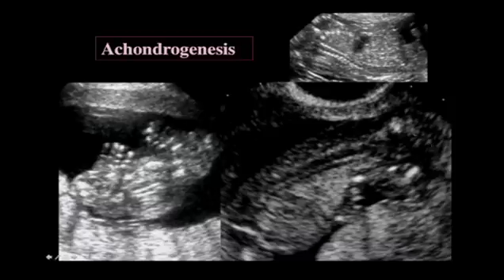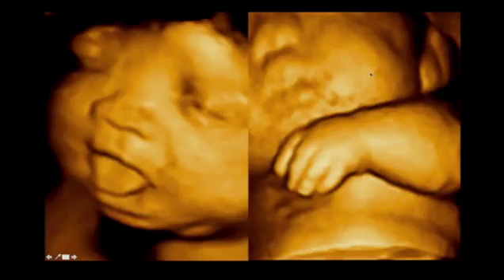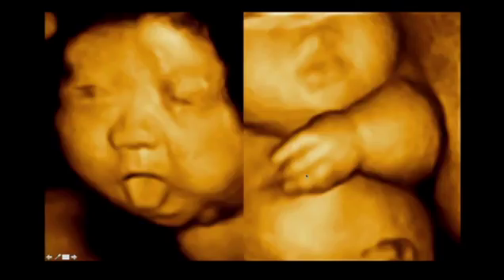And you can see even an older fetus, this is in the 3rd trimester, you lose the ossification of the spine here almost completely. This was the 3rd trimester fetus with this abnormality, where you can see that small mid-face that we talked about early in the talk, but also the incredibly short, almost flipper-like appearance of the long bones of the extremities. And you can see the very short, very narrow chest due to the very short ribs, and how incredibly short the entire upper extremity is.